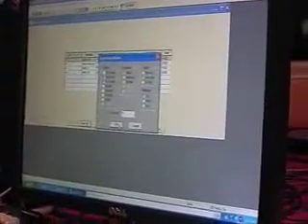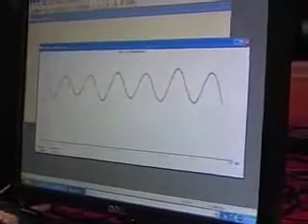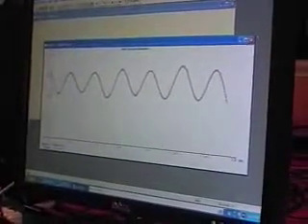Okay. And now I go up here to graph and I say graph data, and I can do a single graph on each picture, or if I take that off, it would be multiple. Let's see, we want to do raw only. If I did raw plus linear envelope, it's confusing if you don't know what it is, so don't do it. It's the smooth function. Go like that. So there's my data.